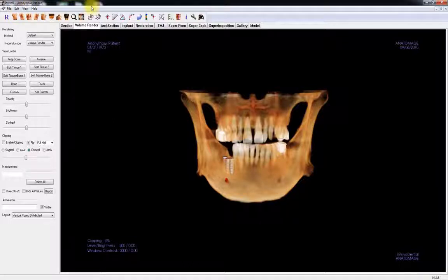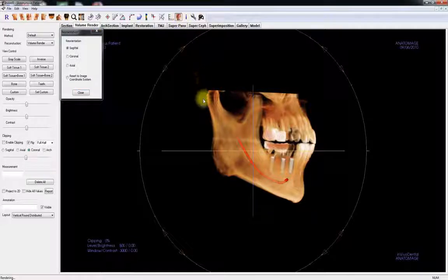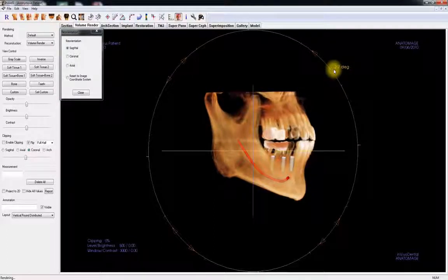Patient orientation can be used to reorientate the patient's scan. If the patient was not properly positioned when the scan was being taken, use this tool to adjust the patient's orientation. You may need to scroll to decrease the radius to use the orange rotational arrows. You can check the patient's positioning from multiple perspectives.